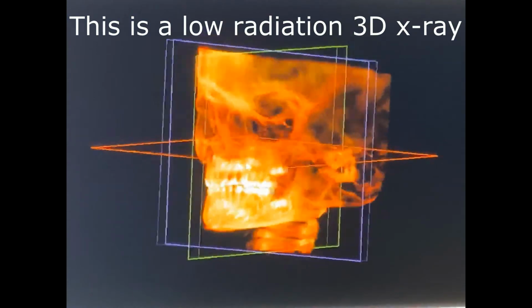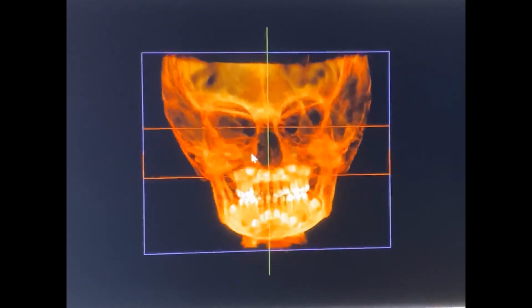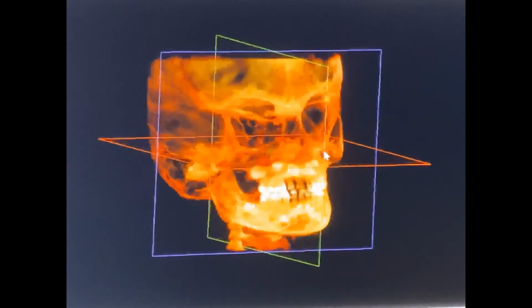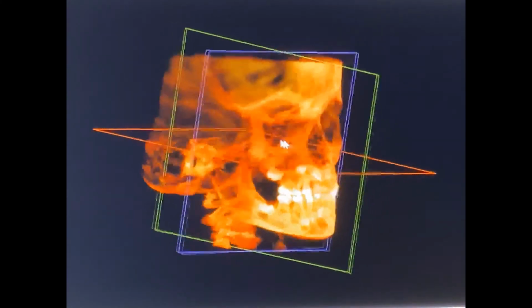We can see everything. I know it's creepy to see a kid with a giant head, without lips, tongue, nose. But remember, because of what we call the cephalocaudal gradient of growth, it means we grow from the head to the body. So the top of the head grows first in kids, then the middle section, and then the bottom. That's why this all looks so small. And that's part of being somebody who's taken 2.5 years in growth and development in kids. We look at this and go, this is normal, right? Of course, there's a brain and a head. It's just not captured in this x-ray.